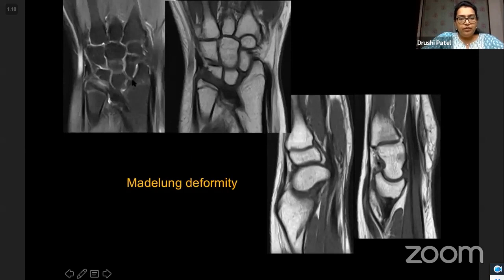So this is the Madelung deformity, resulting in the abnormal alignment. There is sloping of the distal articular surface of the radius, and therefore there's the resultant V-shaped orientation of the proximal carpal row, and the capitate also being pushed more proximally. So that is carpal instability adaptive.